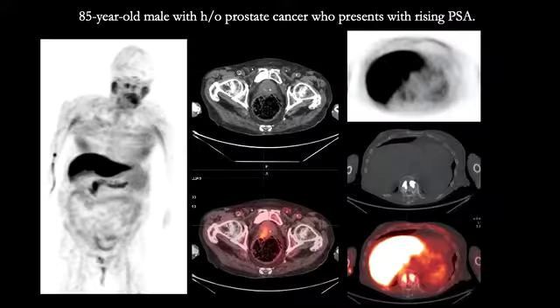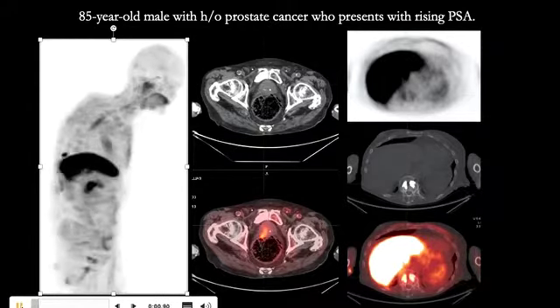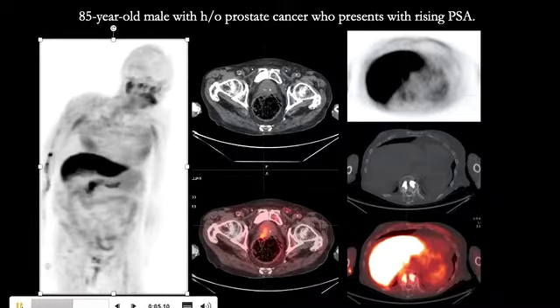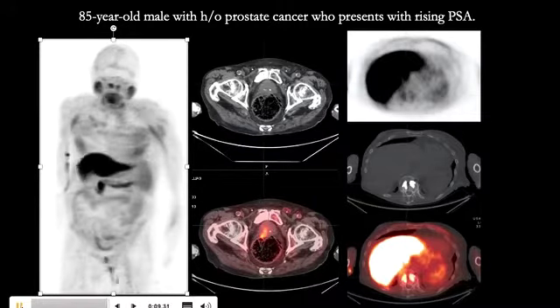Our first case is an 85-year-old male with history of prostate cancer who presented with rising PSA. So the images on this slide are from a F18 fluciclovine PET-CT study, and we will start by looking at the rotating image. The rotating image shows physiologic distribution of the tracer and no evidence of metastatic disease.